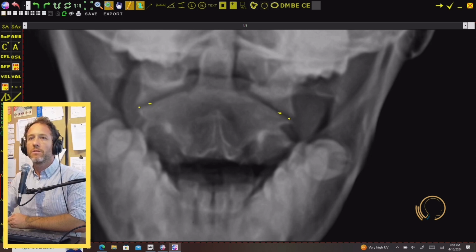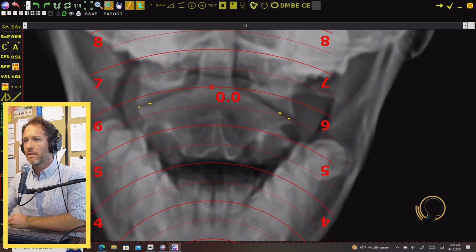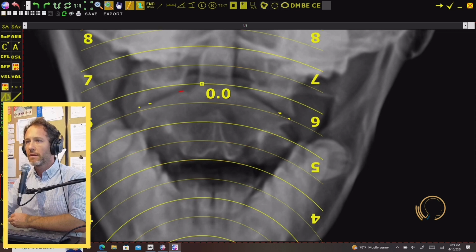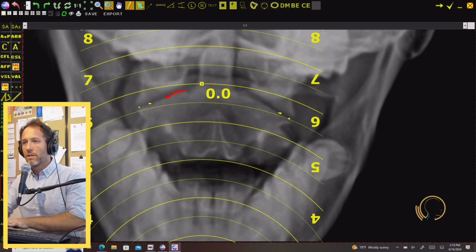then you would throw your AO axial circle template tool on it. Right? And now in my workflow, am I dropping dots? No. I'm looking at that 1/4 inch on the lateral margins and throwing my circle through it. So, that's the zone you want to be looking at. You don't want to be up in here looking at the C2 surface, right? Lateral margin, 1/4 inch right in there.